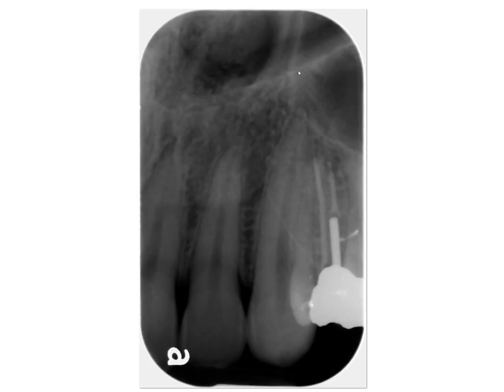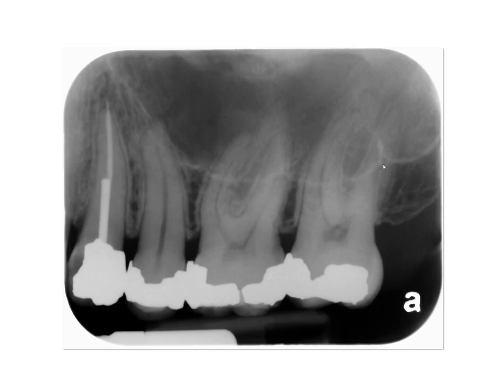Here's the nasal aperture and the maxillary sinus, floor of the maxillary sinus. Again, maxillary sinus, looks like there's a partial septation. And yet again, it's not clear, but we're looking at inferior portion of the zygoma or zygomatic process of maxilla. Having said that, zygomatic process of maxilla is typically located in the area of the first molar. So that's a good anatomic landmark to keep in mind. Yes, it can appear slightly distal to first molar as well. As with any structure, there's anatomic variation.